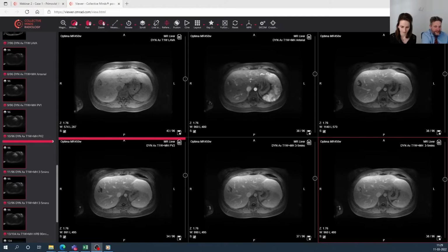Now we're going to present and discuss two liver cases, and we're going to do it the way we do it in daily practice. I will supervise Mira, who will go through the two clinical cases. So Mira, tell me what this case is about. So this is the first case. It's a 32-year-old woman who uses oral contraceptives, and other than that, she has no medical history.